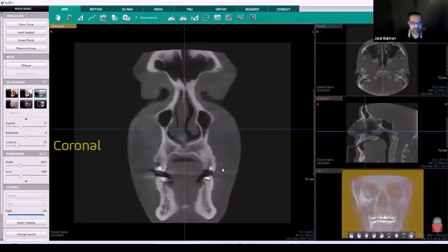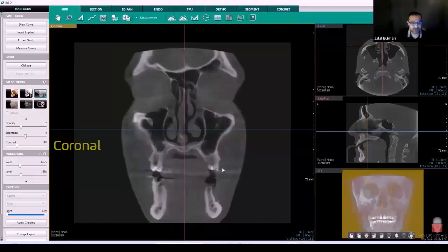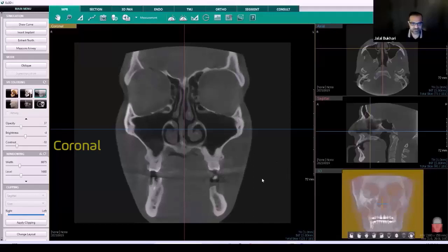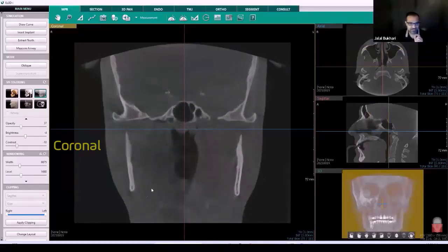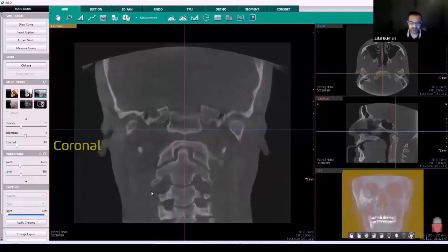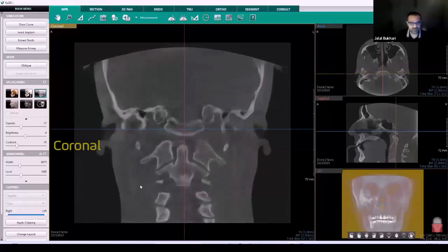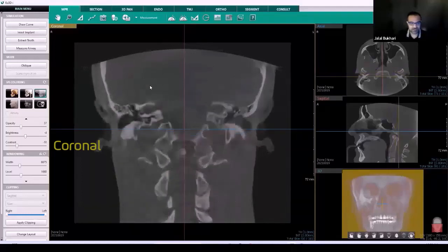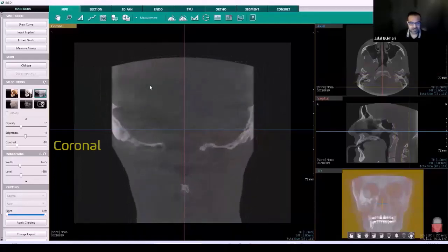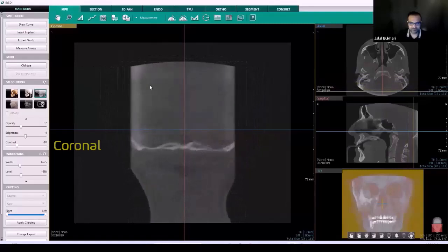Again, looking for any types of calcifications, any types of asymmetry, soft tissue region borders that are adjacent to the osseous structures, to look for any type of mass effects on the bony structures themselves. But again, you're looking for any type of radiopacity that might be showing up in the soft tissue regions. And I'm scrolling back into the neck regions where you will typically find the vascular calcifications, and then into the skull base and still in the neck region, looking for anything out of the ordinary.